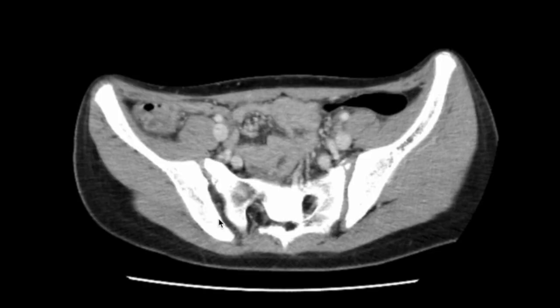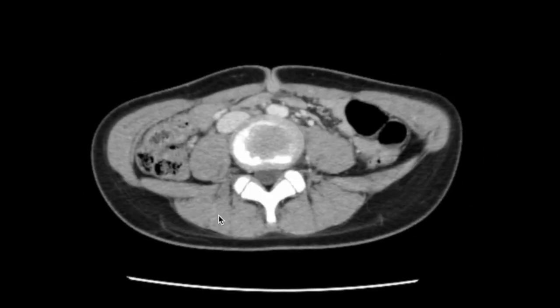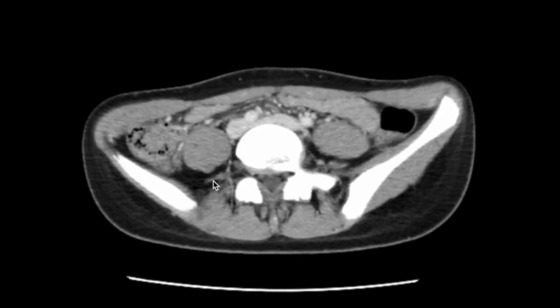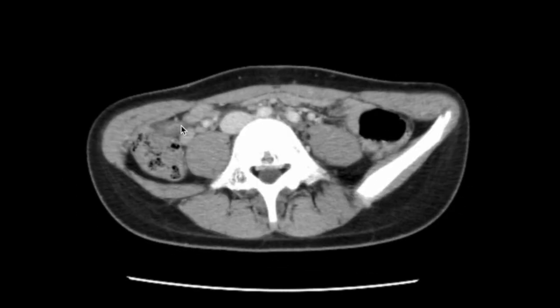Inflammation can also make lymph nodes react and enlarge. How are the nodes here? Near the inflamed appendix, particularly along the superior mesenteric chain, you can see several lymph nodes that are slightly enlarged. Normally, they wouldn't be this prominent, so these immune-related nodes are reacting and swollen.